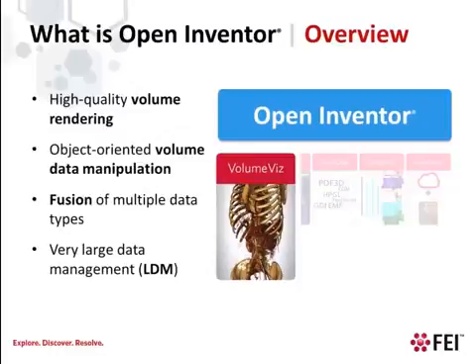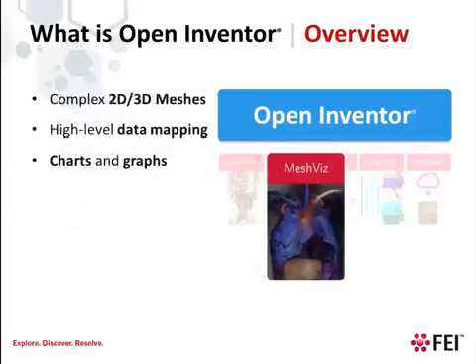The Volume Viz extension is a full-featured toolkit for managing and visualizing image and volume data, whether it's a stack of images from a CT scan, an MRI, an electron microscope, or any other kind of image acquisition system. Volume Viz allows for interactive navigation with very large data sets and even multiple data sets, even when they cannot be loaded in memory. We'll be seeing a lot more of Volume Viz in this presentation.